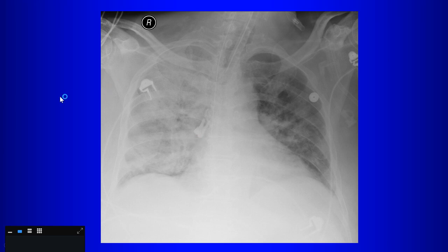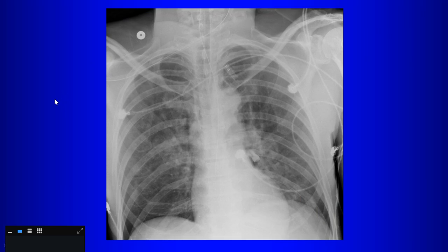Now that you're familiar with that, if I show you this, where? In the left main. Yeah, there's another tooth in the left main bronchus, right? So we're used to, on radiographs, kind of overlooking all these densities that are over the chest because we look through the leads, we look through all these devices that are overlying the chest.